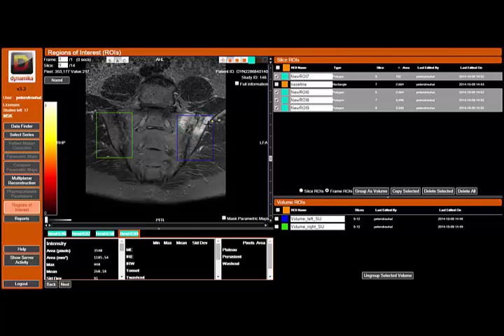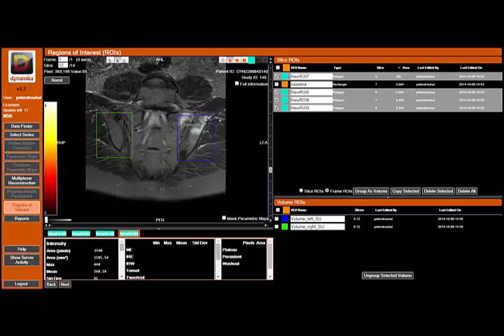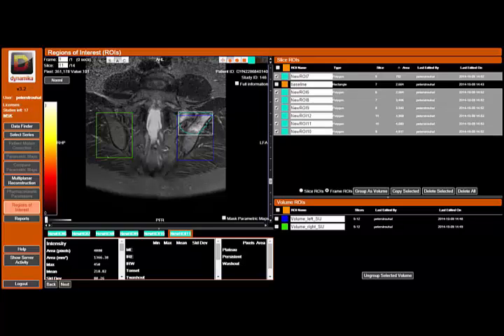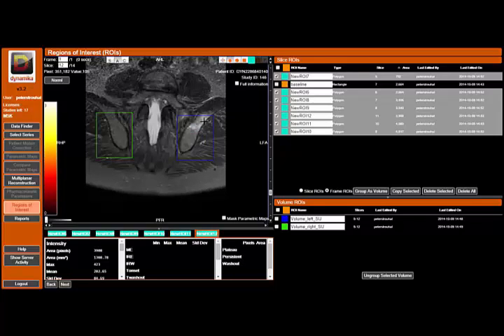Here there is a need to be slightly more precise as you map these regions of interest, but you simply want to do a contour around all the abnormality in question. So in this instance, they're being drawn around the upper or superior aspects where there is particularly high marrow signal around the left sacroiliac joint, within the much larger region of interest around that joint.